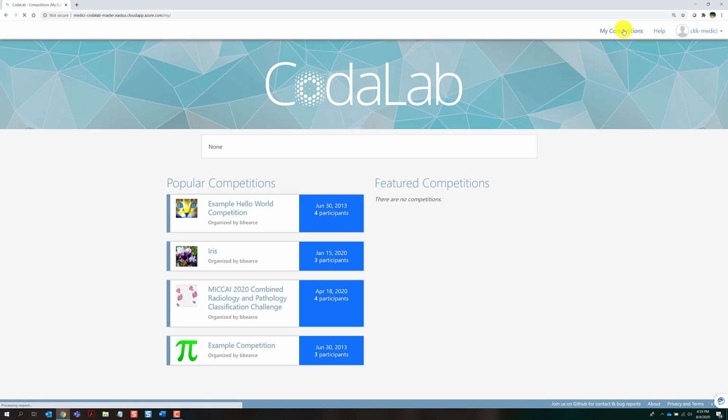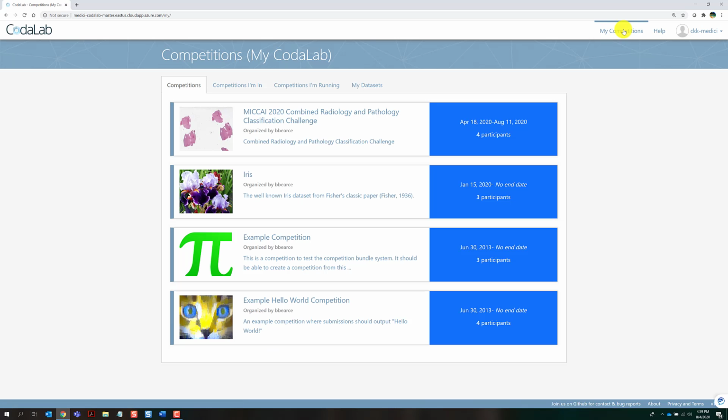For this example, we are using Hello World to demonstrate how to submit results. When you first access the competition, make sure to register for it and accept the terms and conditions. Just click the competition to open it.